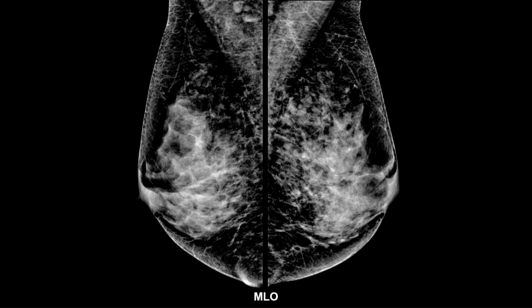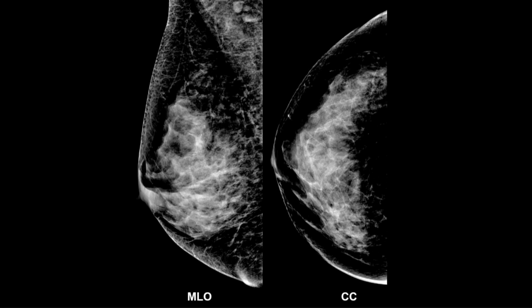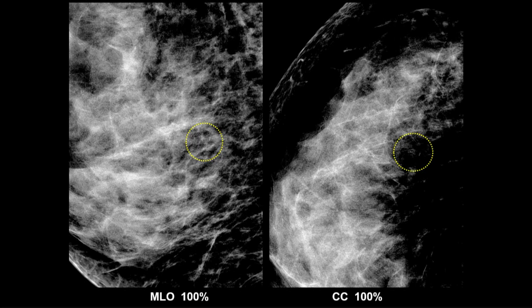So here's a pair of oblique views. Here's a pair of CC views. This is the breast of interest. The finding is here, but you're probably not going to be able to see them, even if you're in the front row, because we're talking about small calcifications. On the other hand, this is where you want to look on your pages to see whether you've marked that location. And now I will show it to you at full pixel resolution. If you're close enough, you probably will be able to see that there are some calcifications in the center of the dotted line circle.